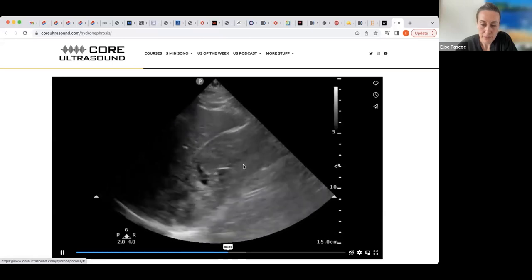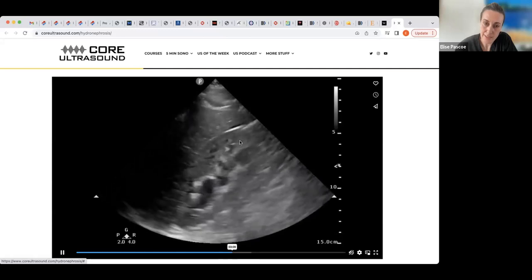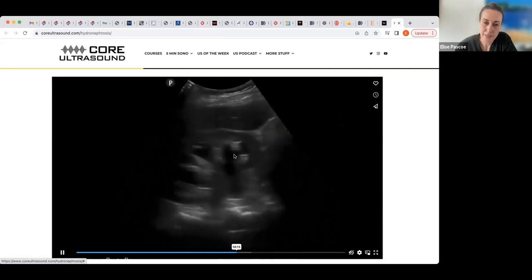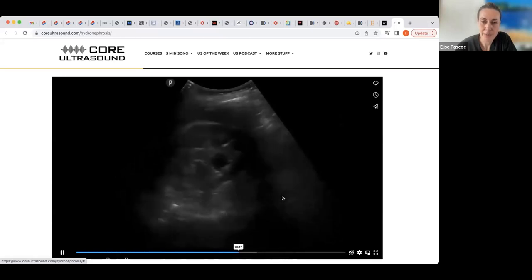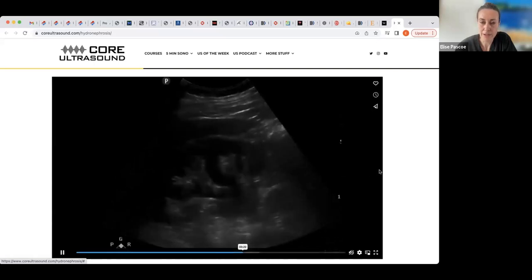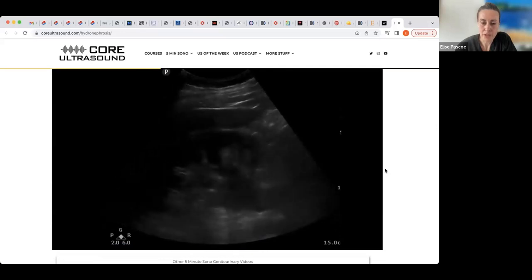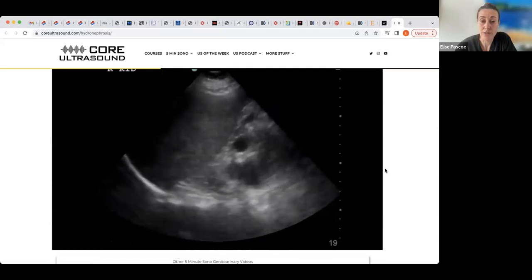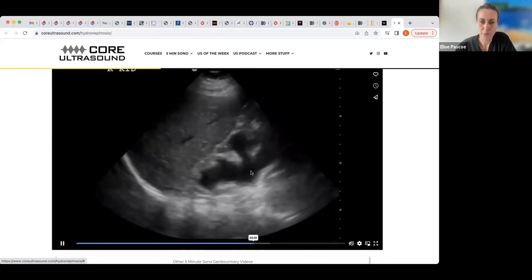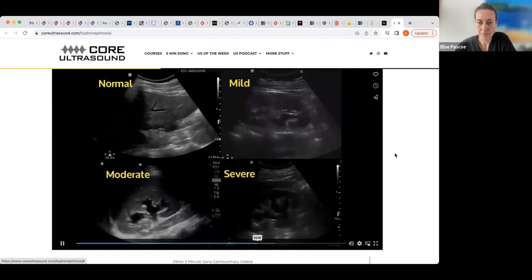This video is reasonably getting through to more severe hydronephrosis, where it appears that we are contiguous with those pyramids. Here everything's looking quite dilated. So as you can see, it's reasonably obvious when there is moderate to severe hydronephrosis. I think we would all, without much training, pick up the presence of hydronephrosis quite well. And this is a really thinned one. We've got quite severe hydronephrosis there. So you've got normal, mild, moderate, and severe.